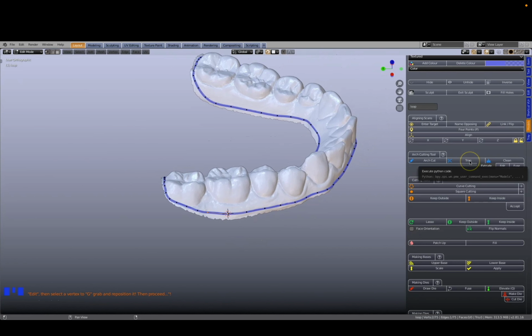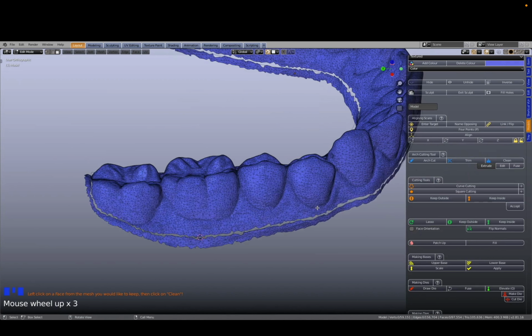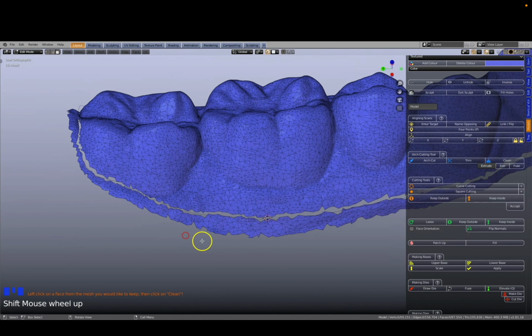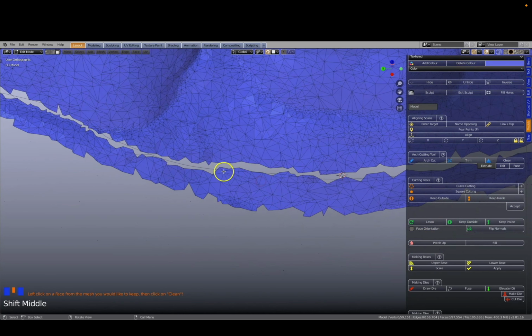Navigate to the menu and press on Trim. Immediately you will see the model in a wireframe mode. This process has entered us back into edit mode. There should be a small gap running between the scan and the unwanted mesh. If you have a closer look, you will notice two thin lines which are wedged between the scan and the loose mesh. This is a cutting tool doing some of the background work.